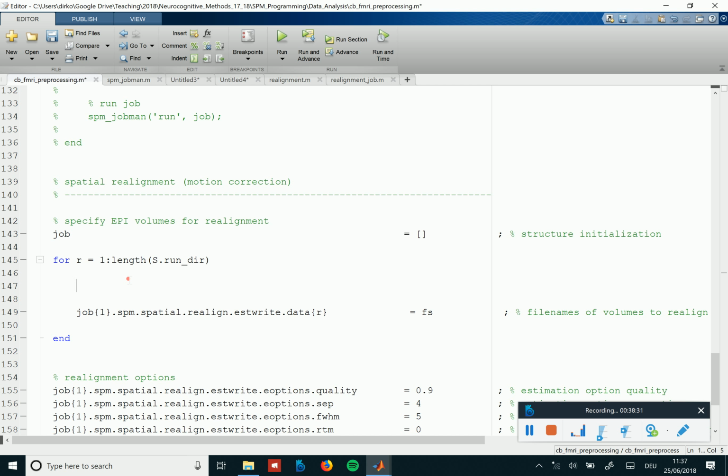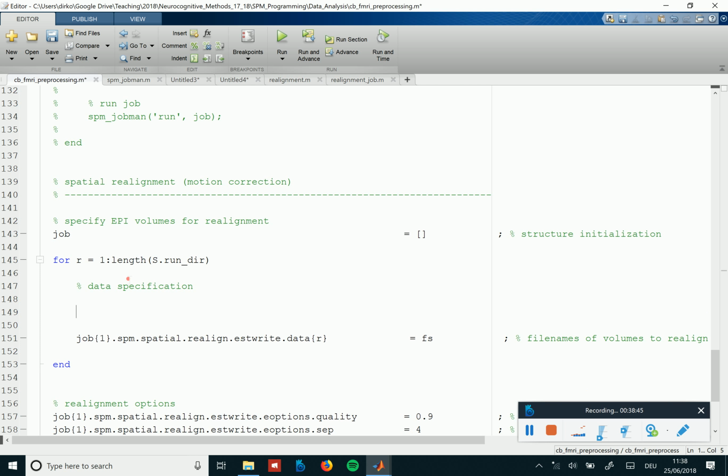And here we are doing it using the filter options by SPM. So SPM has a function that is called SPM select, which is the function that is called when you do this in the GUI. And it has an option list, so it creates a list.